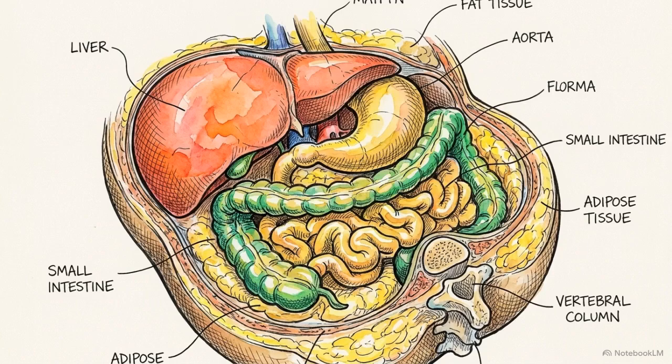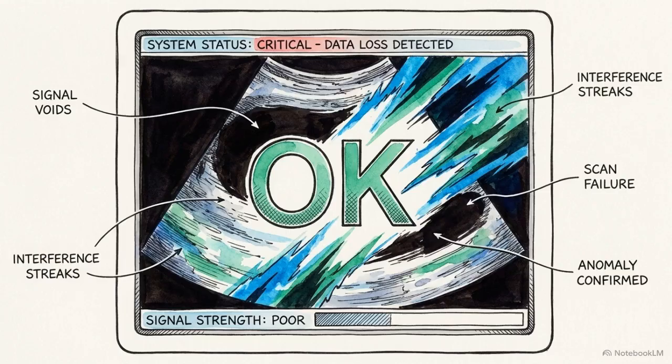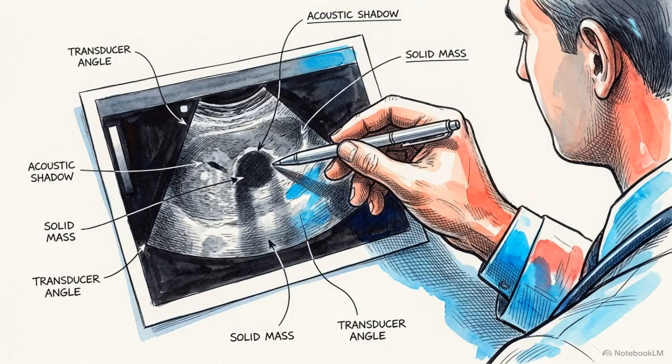Finally, the system expects the acoustic wave to reflect exactly once off any given tissue interface before returning cleanly to the probe. Human anatomy is rarely uniform. Specific tissues and substances routinely break these four rules. When anatomy violates these acoustic parameters, the machine does not output an error message. It simply applies its algorithm and confidently plots a false image. These predictable mathematical misinterpretations are sonographic artifacts. Recognizing them is what allows a clinician to distinguish anatomy from acoustic error.